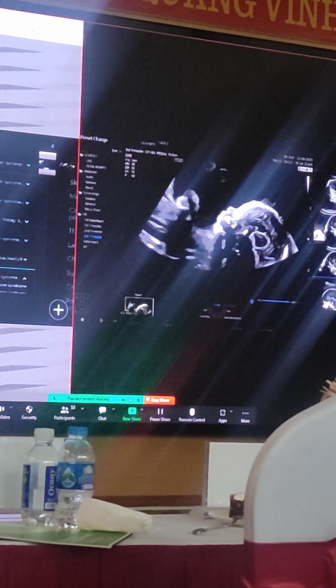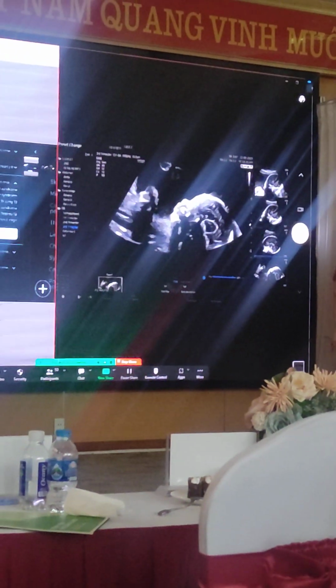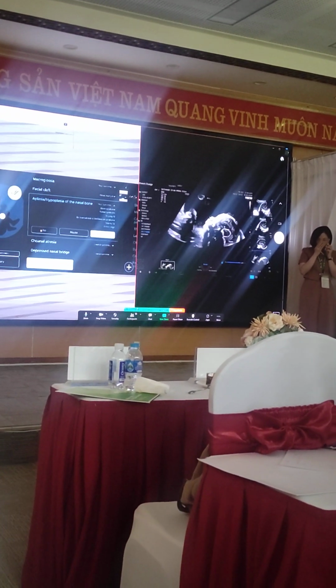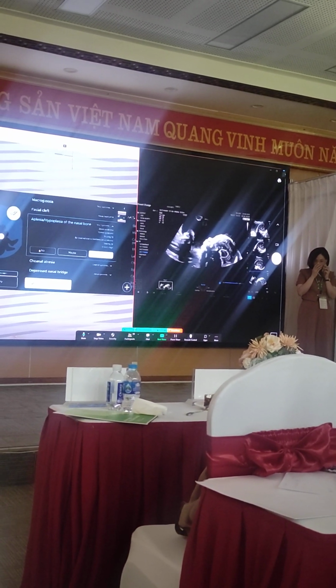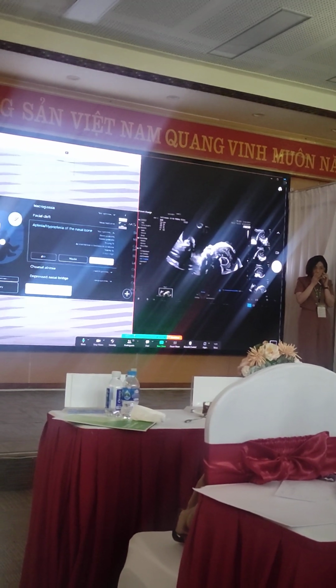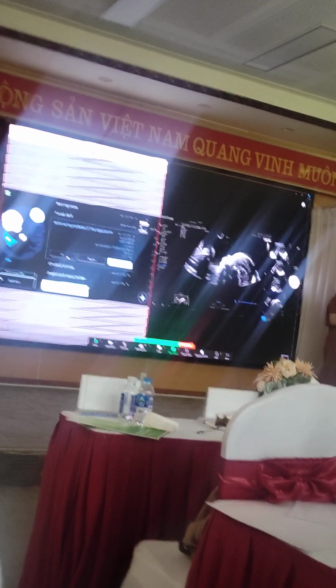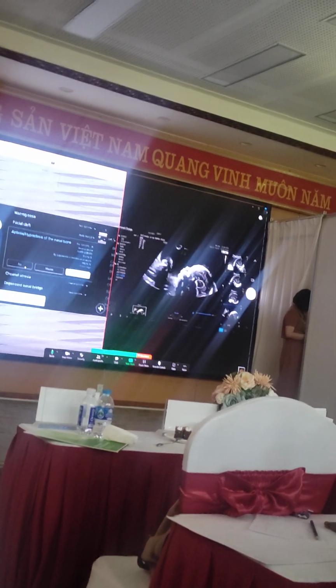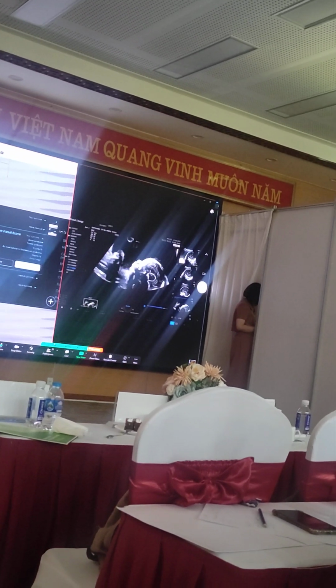So obviously, when you look at the profile and the face, you come to very often subjective matters. Among the subjective matters is the size of the nose, the aspect of the philtrum, the position of the chin. What you can say here, at least, is that there is no prognathia, neither retrognathia. Everything is aligned as it should be. Whether the nose is small or not, these are the nasal bones, whether they are short or long. Actually, I never care about these things. And there are ethnic differences, obviously, so we're in Asia, so I don't know how to interpret that.